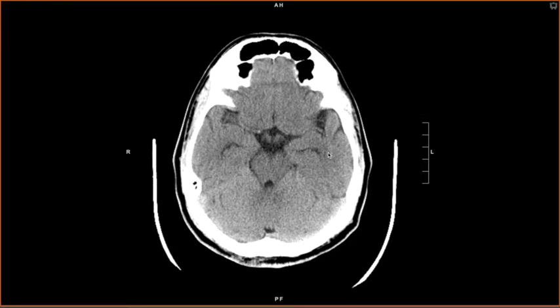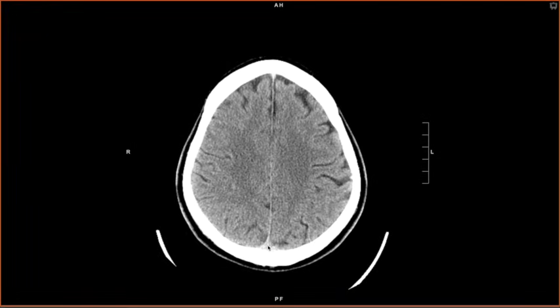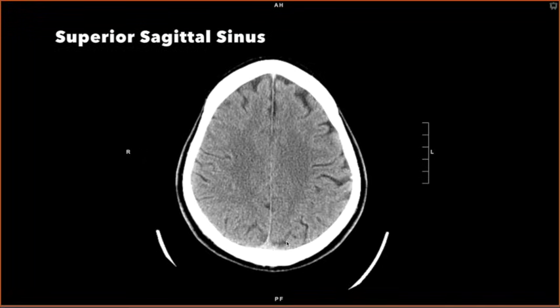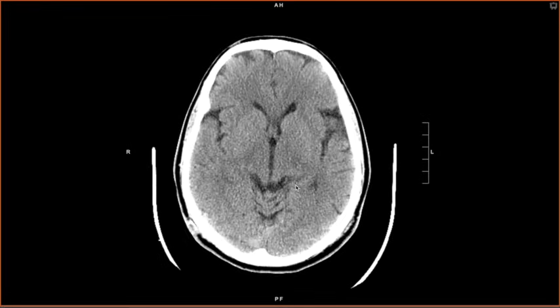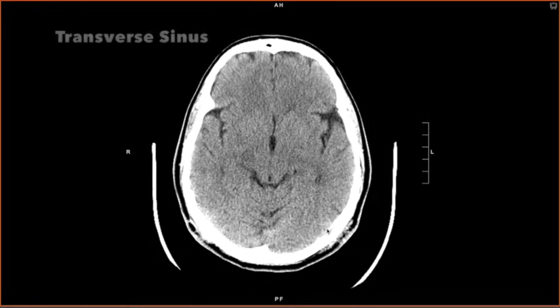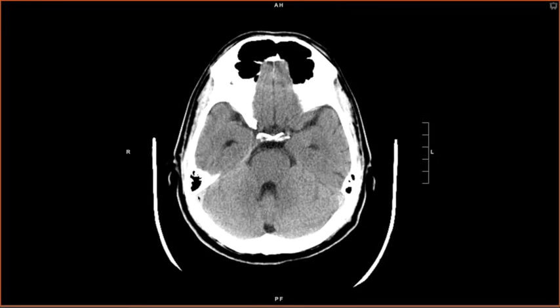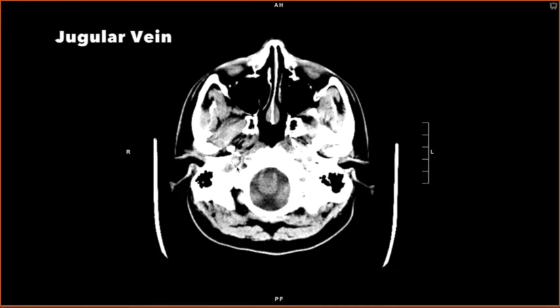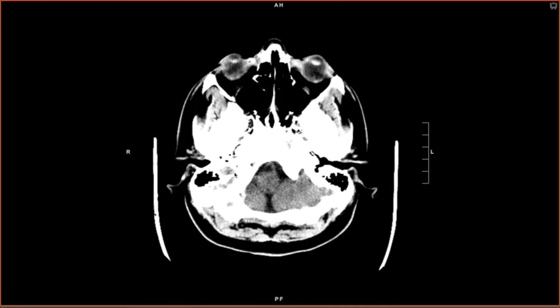Blood drains from the brain parenchyma into veins, and then eventually gets into the venous sinuses. The basic venous sinuses that you're going to look at on CT head are as follows. This here is the superior sagittal sinus. Okay, superior sagittal sinus separates down here into the transverse sinuses, and the transverse sinuses become the sigmoid sinuses here, and eventually the jugular vein beneath the skull base.